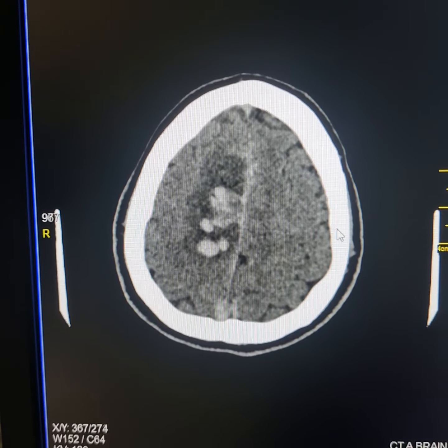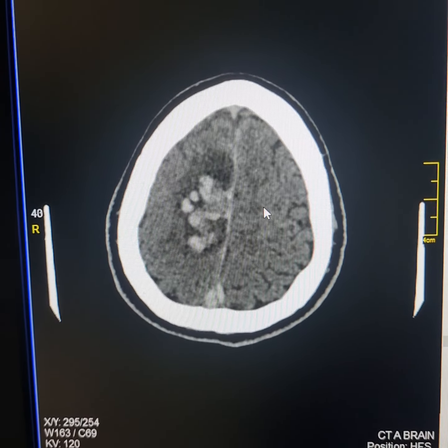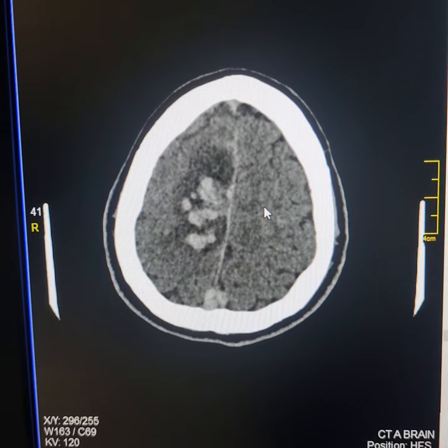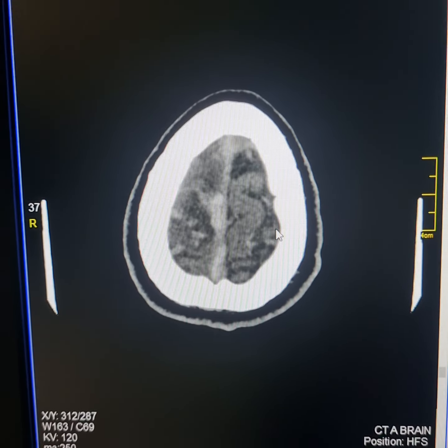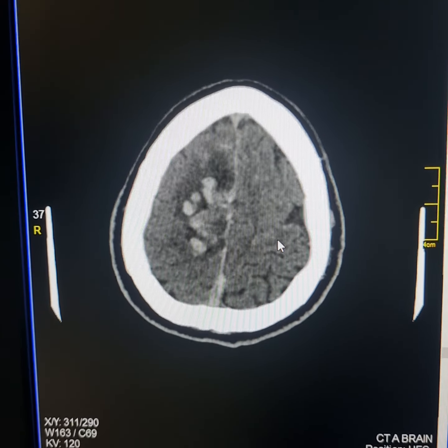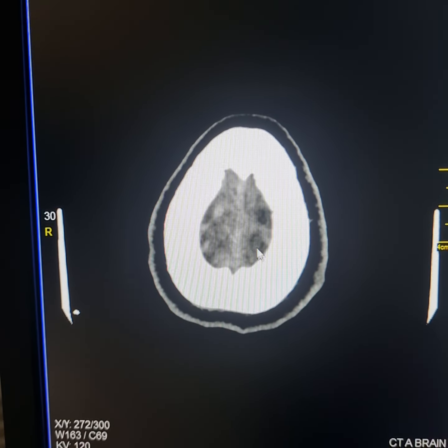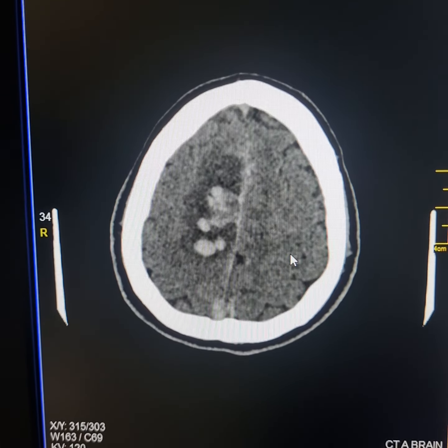Now this was labeled as the intracerebral hemorrhages. Now we have to very carefully see and examine and then comment upon the final diagnosis because the management differs. Now please observe these hyperdense superficial cerebral veins along the outer surfaces of upper parts of both the parietal lobes. Similarly, upper part of the superior sagittal sinus is also hyperdense. Please see this hyperdense. This is also suggestive of being thrombosed.